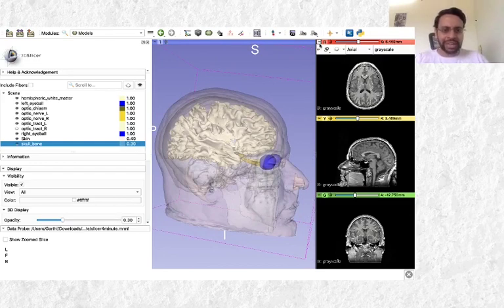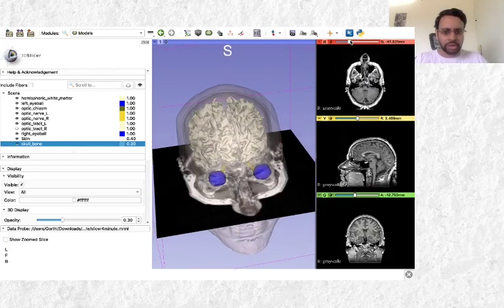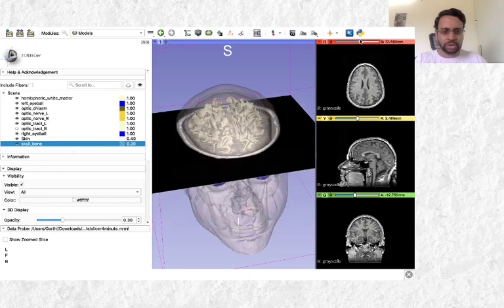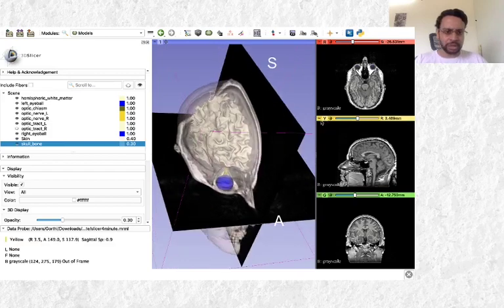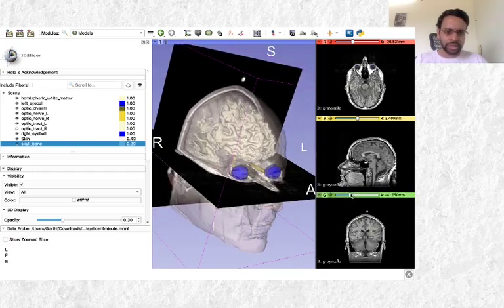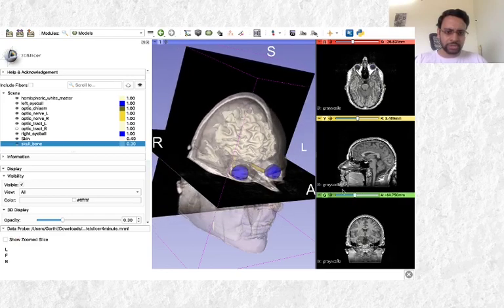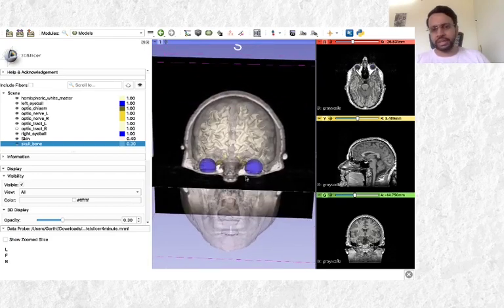Another thing is, I could in fact along with this show you the particular slice here. Now by moving it, I could simultaneously show you the volumes as well as the slice. Let me also take a look at this slice, maybe not this slice. Okay, now I could move here and see the information whatever I want to take a look at, simultaneously the volumes as well as images.